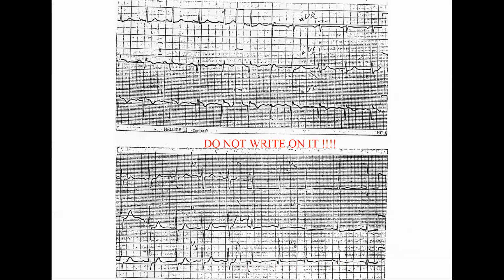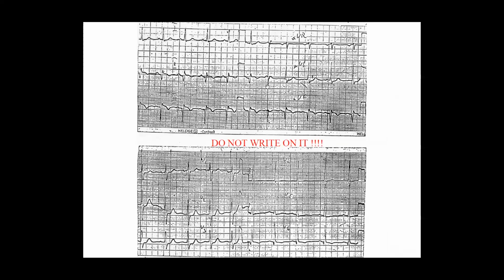Good. All right. Let's see this one. Now, who is going to solve this ECG? Whoever practiced a little bit, please. Who studied for today? Nobody.